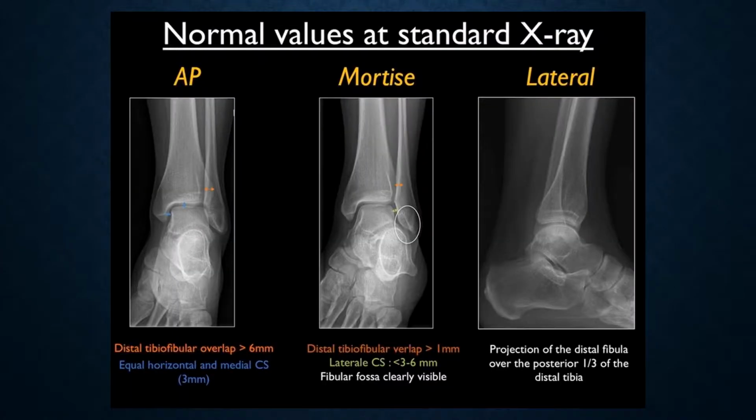These next two slides show how we can tie everything together that we've talked about so far when looking at x-rays for ankle syndesmosis injuries. Sometimes it's nice to compare everything side by side, especially when looking at an AP and mortise view.